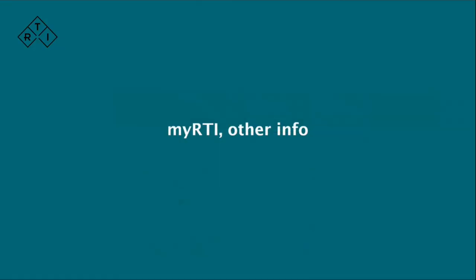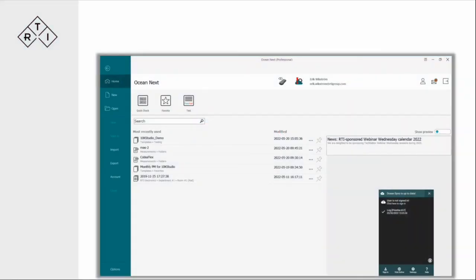All right. And then there's some other things around myRTI. We talked about the Ocean Sync. This is the Ocean Sync software panel. It runs in the background, and this is what it looks like if, for some reason, the synchronization has been lost and Ocean Sync is not running. You see the small icon up here with a red exclamation mark indicating that something is wrong with synchronization, and then this pops up.